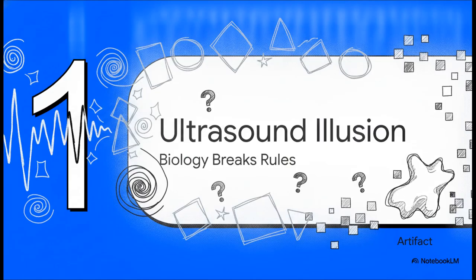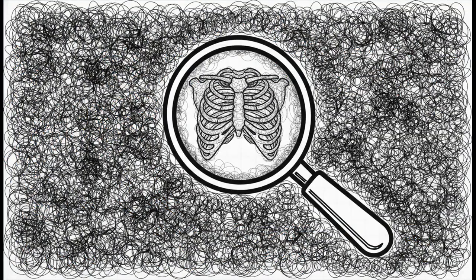All right, Section 1, the ultrasound illusion, or what happens when biology breaks the rules. So, when biological tissues refuse to play by the machine's rigid rules, the computer just gets confused, and that results in what we call an artifact. Now, it's incredibly tempting to look at these artifacts on a messy screen and get super frustrated by what just looks like image degradation or annoying static. But we actually need to reframe the problem here. Artifacts aren't just noise, they're readable clues. They are essential evidence for our medical investigation, and they literally point us directly toward exactly what kind of tissue, or maybe foreign material, is hiding under that probe.